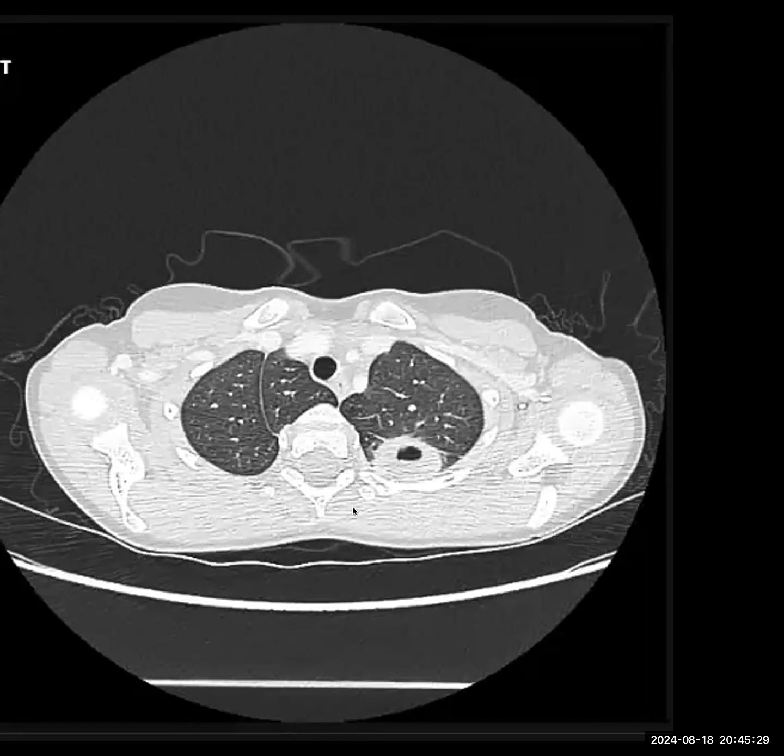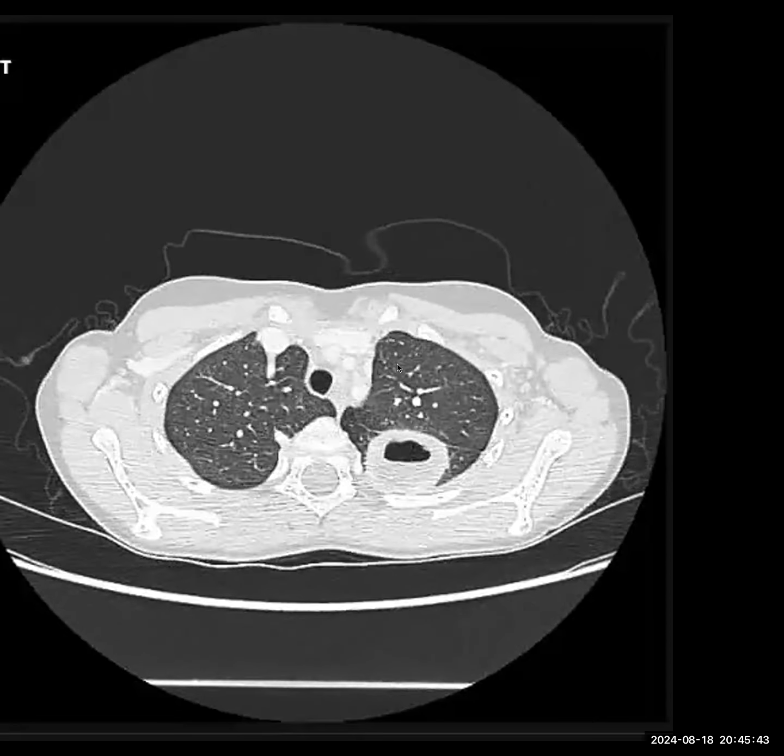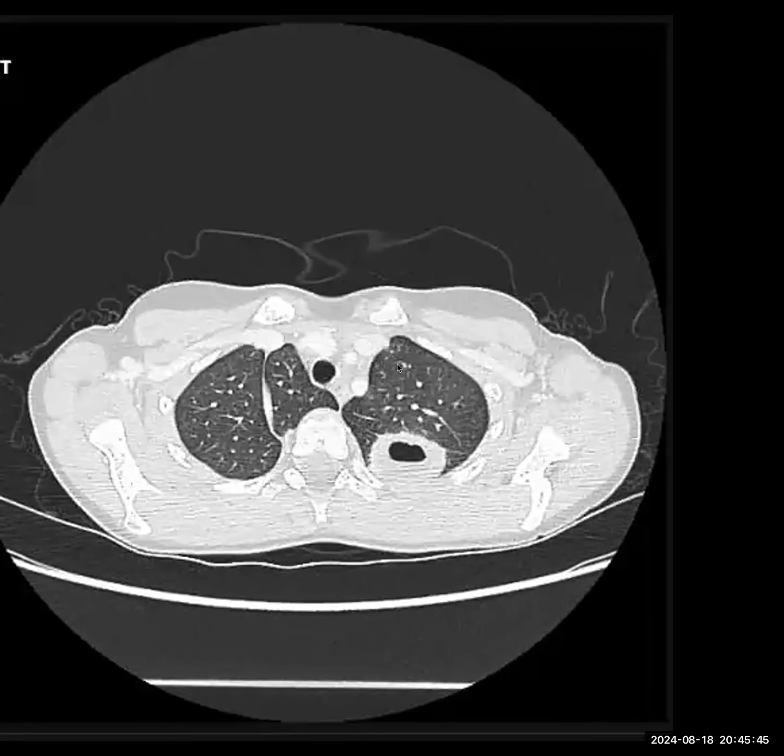Otherwise, I think you finished the cases well. You are mentioning MDTs at all the required points. Coming to this case, this was a case of Wegener's granulomatosis. But the fact that you cannot completely exclude malignancy, it was good on your part to refer it to the MDT.